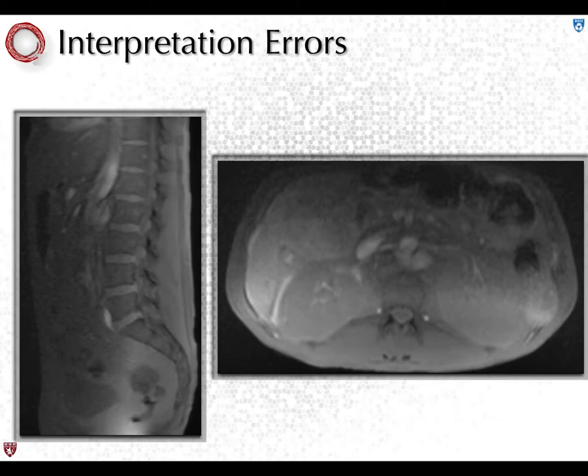Five days ago, the patient was transferred here with a questionable history of lymphoma. It was a youngish person. The patient had back pain, so they ordered a lumbar spine MRI. And this patient's young, 30s, I think. Lumbar spine MRI. Does anybody see anything? These are the localizers from the lumbar spine MR.